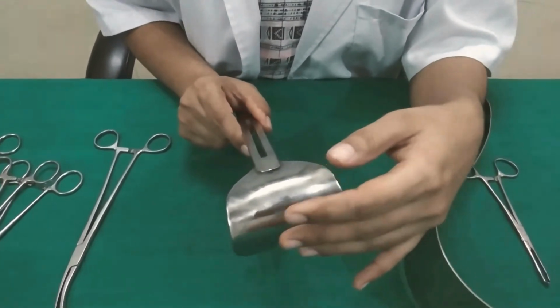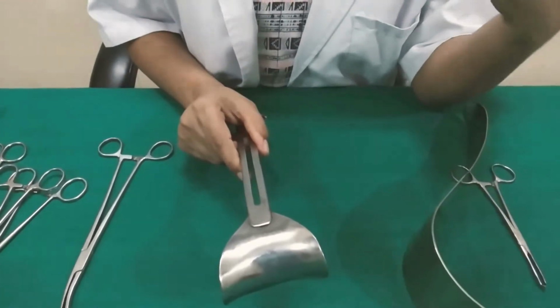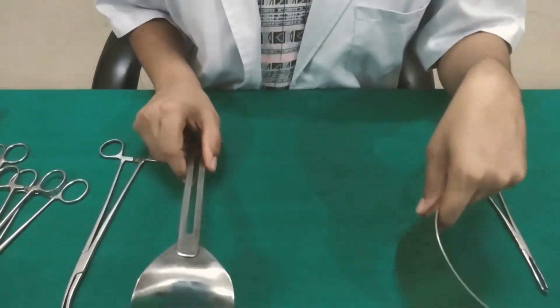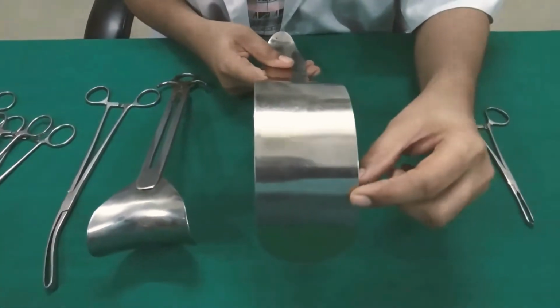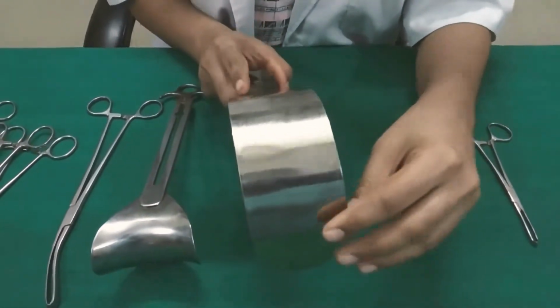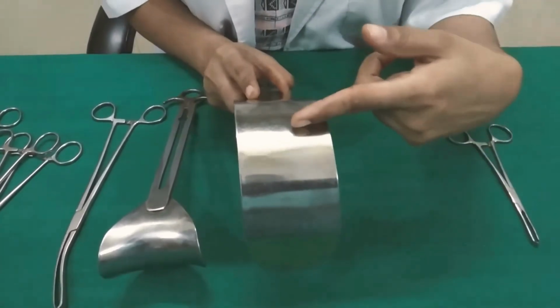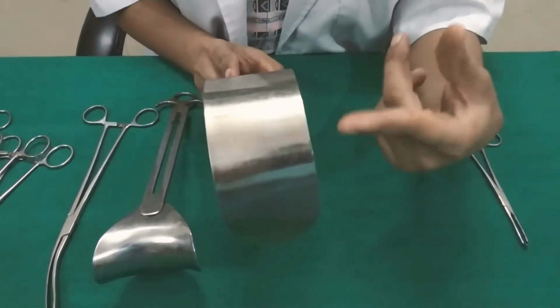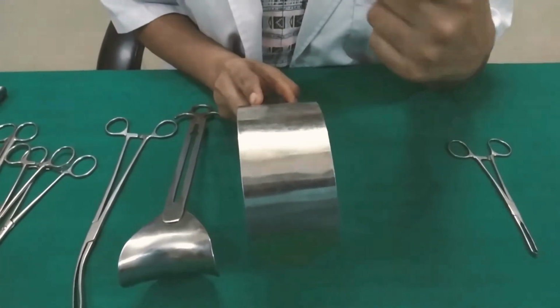So what are the indications? It is used in procedures like cesarean section, laparotomy, abdominal hysterectomy, etc. Another instrument is the Deaver retractor. This instrument comes in various lengths and widths to make it useful, and it is usually used in gynecological procedures. Since the blades are thin, it occupies little space, and thus it is an ideal instrument while we operate in depth.